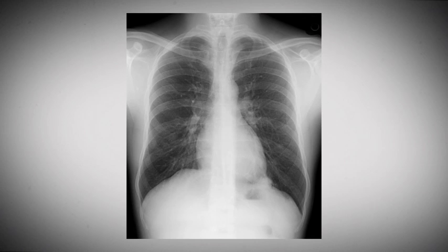If there are lesions in these locations, they change the opacity seen in the chest film and may silhouette out the normal diaphragm or the normal heart borders. The classic silhouette of the aortic knob and the pulmonary artery are additional key items to watch for, and if the normal concavity of the aortopulmonary window or notch is obliterated, further investigation is warranted, usually by getting a CT scan.